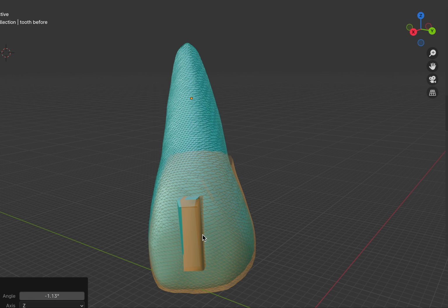this one, and the aligner material, and you can see the deformation right here. Obviously there are some other contact points on the tooth, like here and maybe here, but you can see really that the attachment is responsible for the majority of the counter moment expressed by the aligner material, and that's important to remember. Thank you.